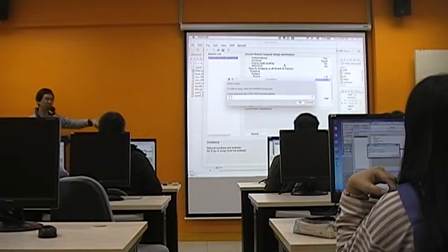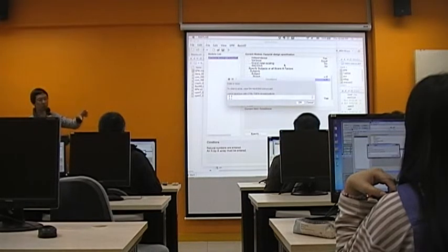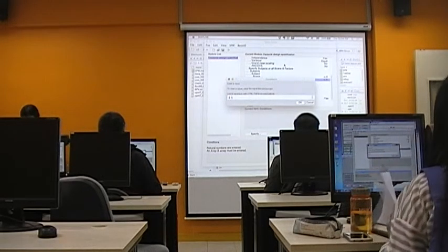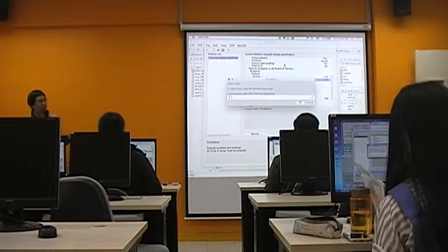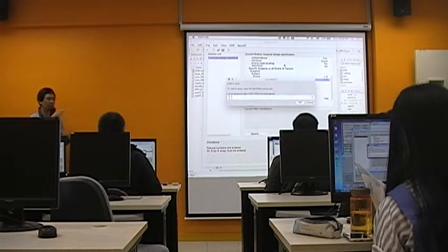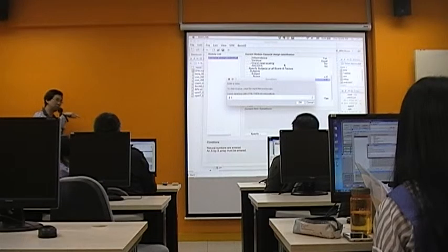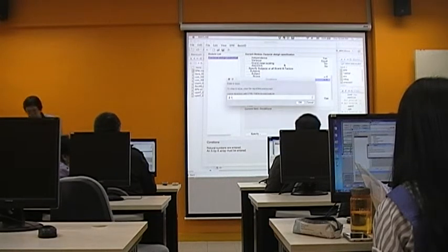The first column corresponds to the working memory load, the second column corresponds to the subject factor. So the first beta corresponds to the one back task and subject 1, and the second image corresponds to the two back condition and subject 1. Okay?